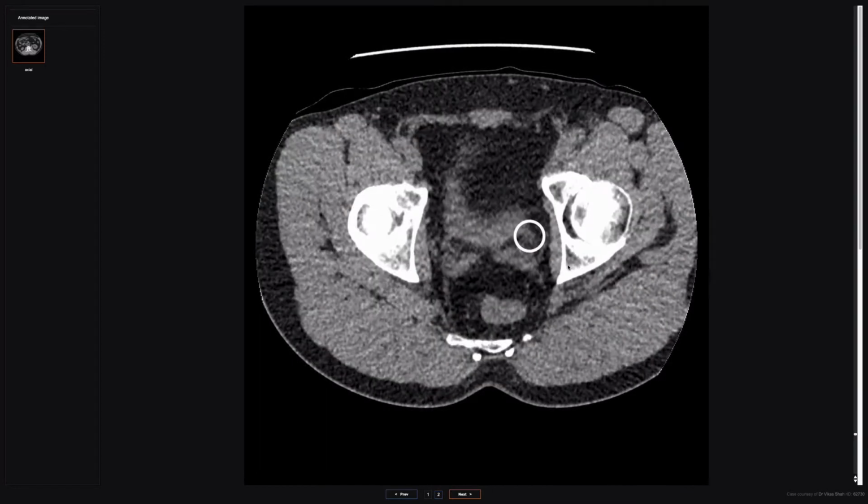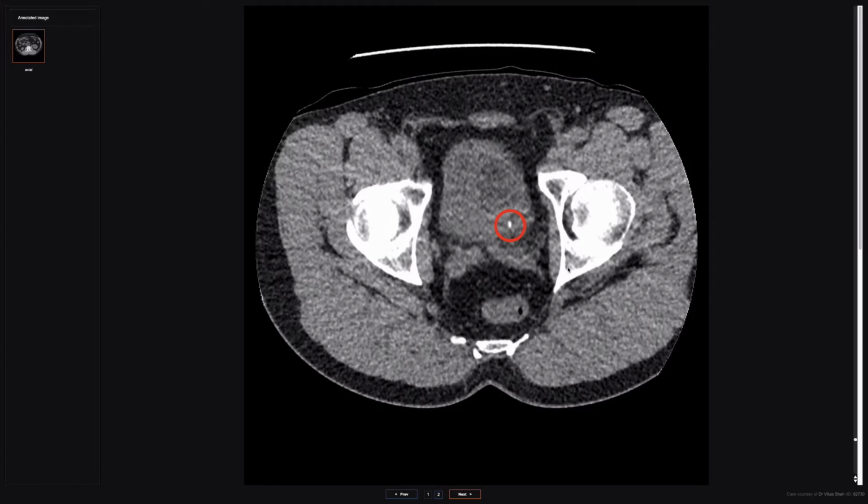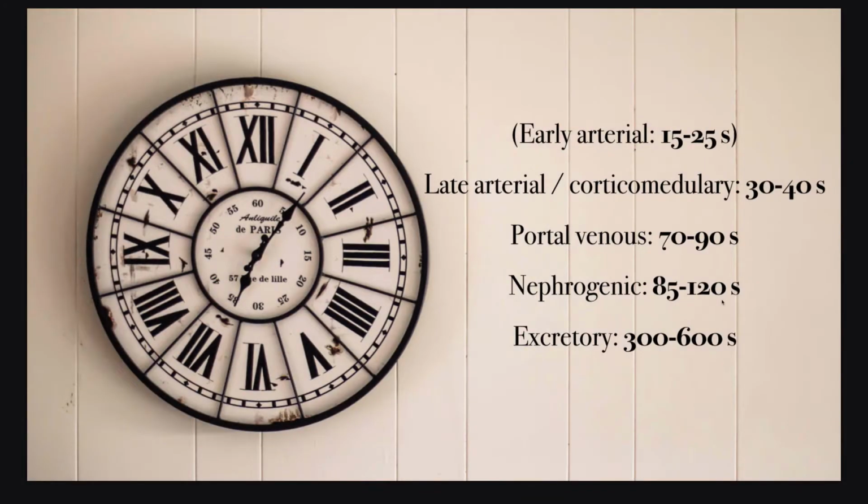So you can have a look at this case on Radiopaedia and bookmark it and have a look at the path of the ureter. So let's talk about the actual, that was a non-contrast CT. So really the main indication is for looking for stones. There is one other one that we're going to come to in a little while. But the vast majority will be contrast enhanced CT.